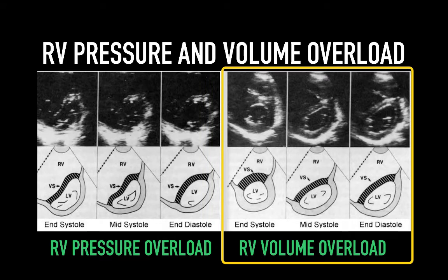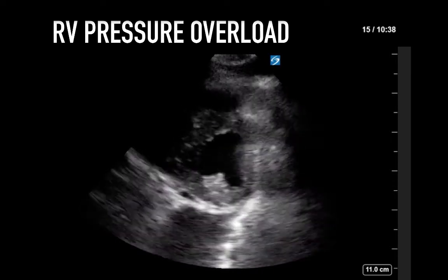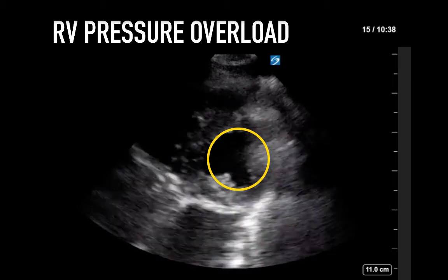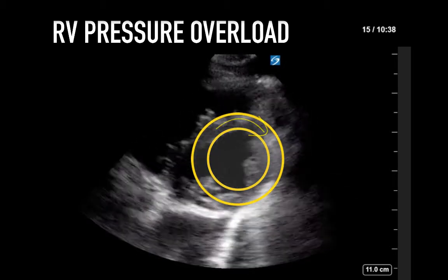With predominant RV volume overload, the maximum reversed curvature is seen in mid-diastole, with the influx of volume into the RV. The septal curvature tends to normalize during systole. This is just a basic rule, and certainly can be wrong under certain circumstances. You can see on this image that the D shape is persistent throughout diastole and systole. You will need to make sure that you can see the entire LV wall thickness, as this impression is easy to create with a poor short axis view.